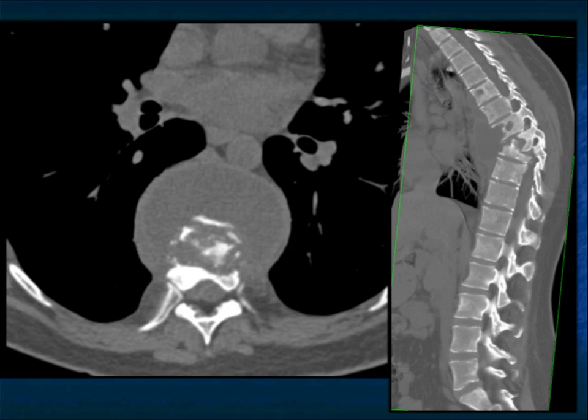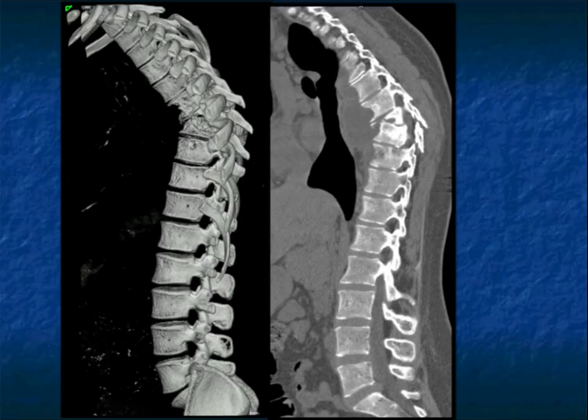Now that's compared to this case. Look at the large paraspinal mass, but the really gross bone destruction. Look at the extent of the destruction of these multiple vertebral bodies. This one's collapsed and basically chewed away. You have a discitis at multiple levels. You have additional sites of disease a little bit higher. That's a very aggressive process. It's interesting how infection at times can look very aggressive and simulate malignancy. Maybe you would think about a plasmacytoma. Maybe you would think about metastasis from a renal cell.